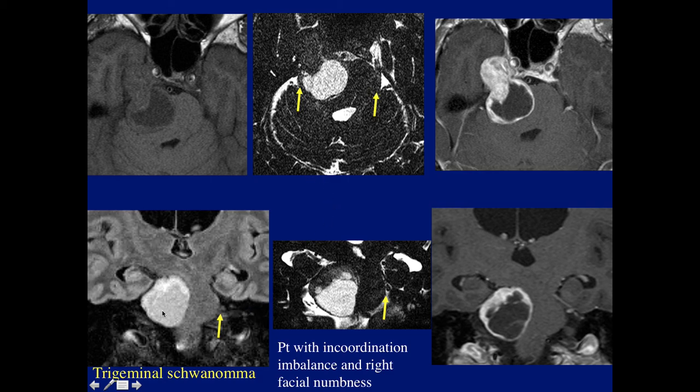It's a little unusual that we still see it as clearly here. And you would expect with this kind of lesion that you wouldn't identify it. I don't know if maybe that's not the trigeminal or just a part of the capsule, but it looks somewhat like the trigeminal in this projection.